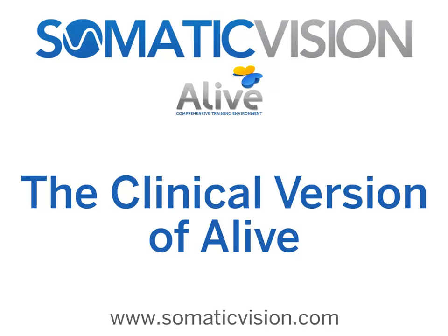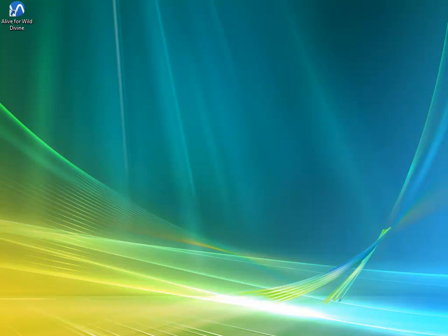Hi, my name is Ryan Deleuze, and I created Alive. This tutorial is on the clinical version of Alive, and this covers the basics of the clinical version.